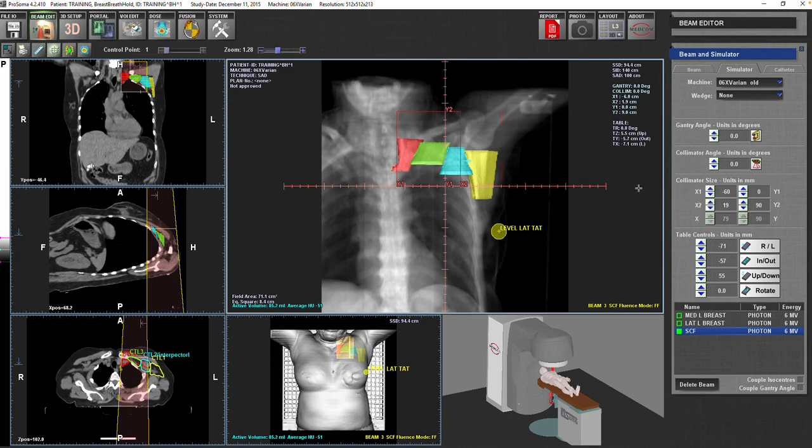And this is why it's very nice to draw your target. That's what I'm talking about. What is the value of drawing my target if I'm going to use it as field-based? Then you can do it like that and then shield your humerus. I'm not intentionally taking level 1 at all, and maybe taking part of level 1 in the field, but my concern is about level 2 that the surgeon didn't touch. So by just drawing it quickly in a few minutes, I can now place my border and know exactly where my target is, and this is also very useful.